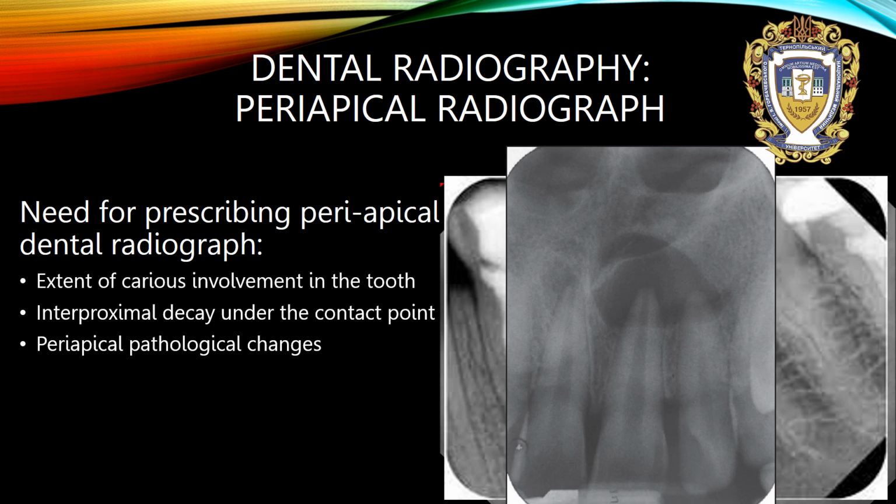But this tooth was not previously endodontically treated. Maybe it is a complication of deep caries treatment, and as a result pulpitis developed, and at the next stage, periodontitis and cyst.